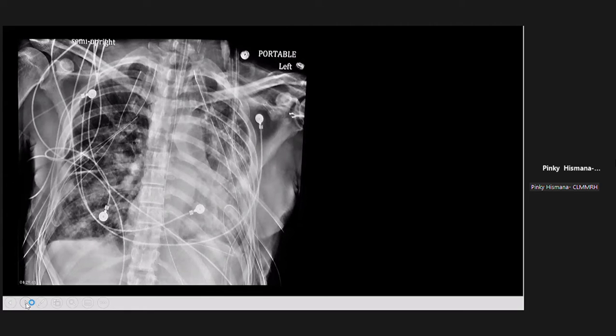At times your patient will have this. What we do is identify the most important lines here. Part of the assessment of chest X-rays with lines would be to determine whether these lines or tubes are in place.